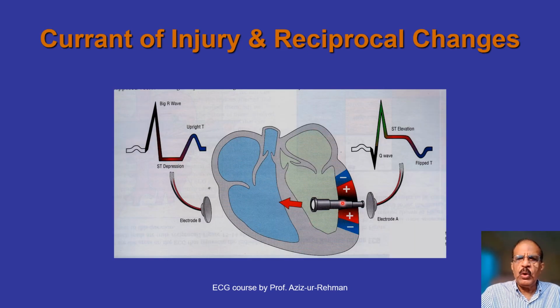And this is also the same thing which we discussed. If this is infarcted part, say anterior wall, the anterior lead would show changes, ST segment elevation, followed by T wave inversion, followed by Q wave, depending upon when patient presents. If patient presents early, there will be ST segment elevation alone. If patient presents little late, after a few hours, there would be additional T wave inversion. If patient presents after many hours, then there would be Q wave also present. So depending upon the time, you would see the changes. And in opposite lead, you might see ST depression.